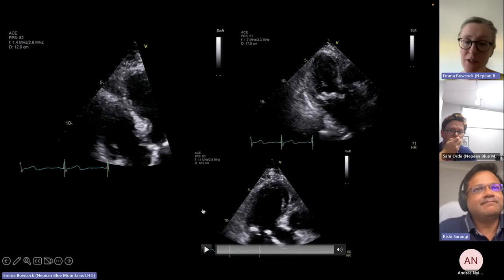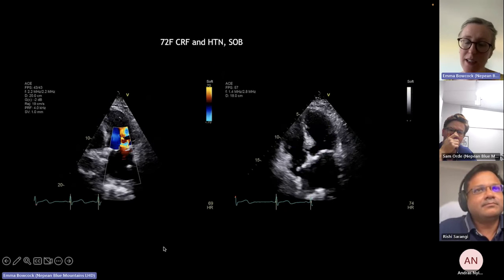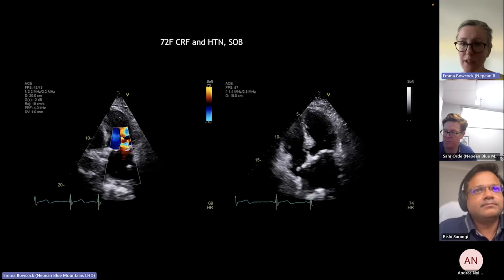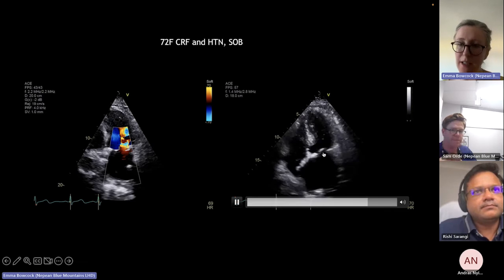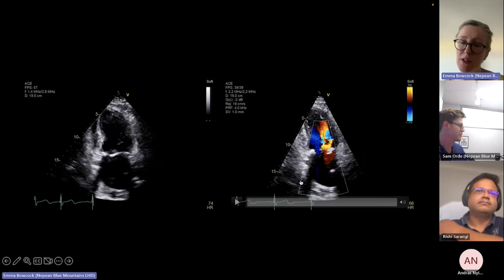You definitely might see mitral annular calcification. And that's what I was wanting to hear clearly from the beginning: it's mainly the annulus that's heavily calcified. There are ways that you can grade MAC, mitral annular calcification, as mild, moderate, or severe. To me, this is moderate to severe mitral annular calcification. And the leaflet tips themselves, you can't really see them that well here. The other thing on this one is the bowing across, suggestive of raised left atrial pressure.